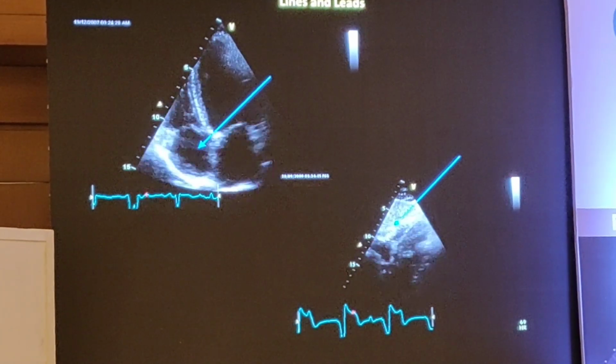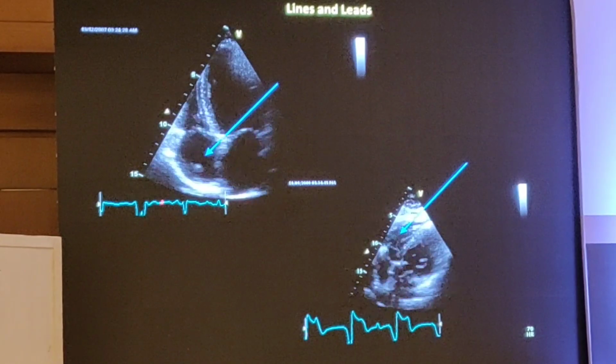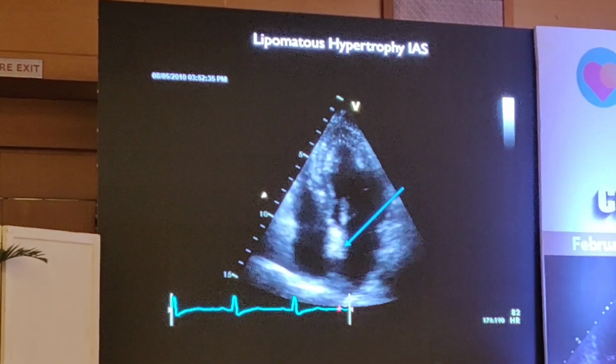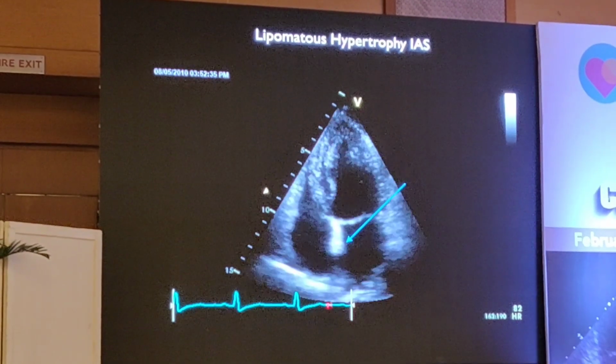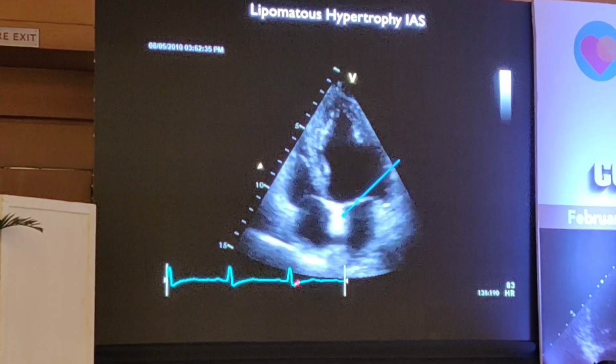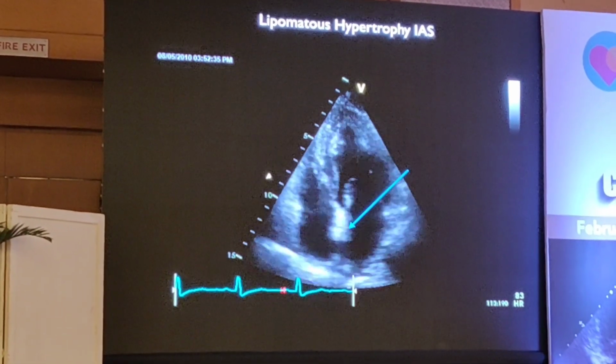It's very easy to identify; generally you can make out something which is put in. Otherwise it is a possibility of lipomatous deposition. Of course you have to differentiate from other forms of thickness in other pathologies, but this is one in your checklist which you should think of.